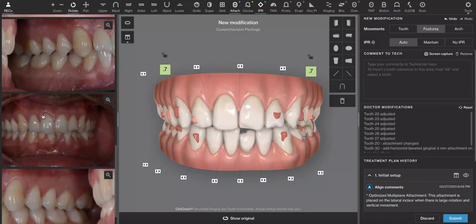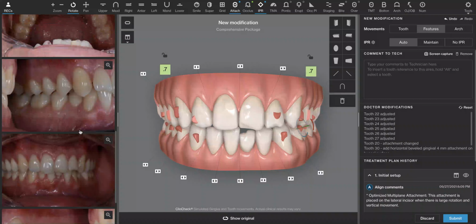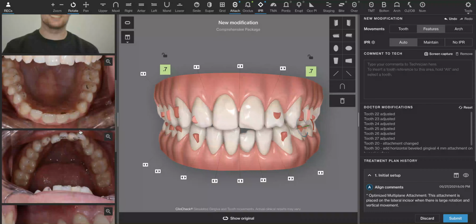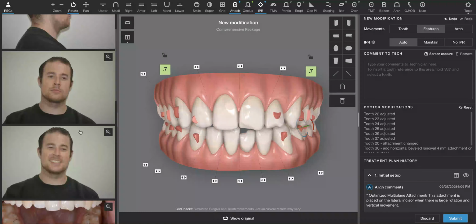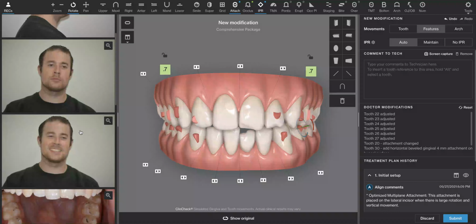You know, we could talk about the clefting of number 8. That's not normal. That's another sign of entrapment, chipping of anterior teeth. Cases like this, I always like to tell the patient this is age inappropriate wear or age inappropriate symptoms or signs to drive the point home that this is only going to get worse with time. And there'll come a point in his life when he has much less in the way of options. So maybe throw in some free whitening for the guy and you'd be good to go.